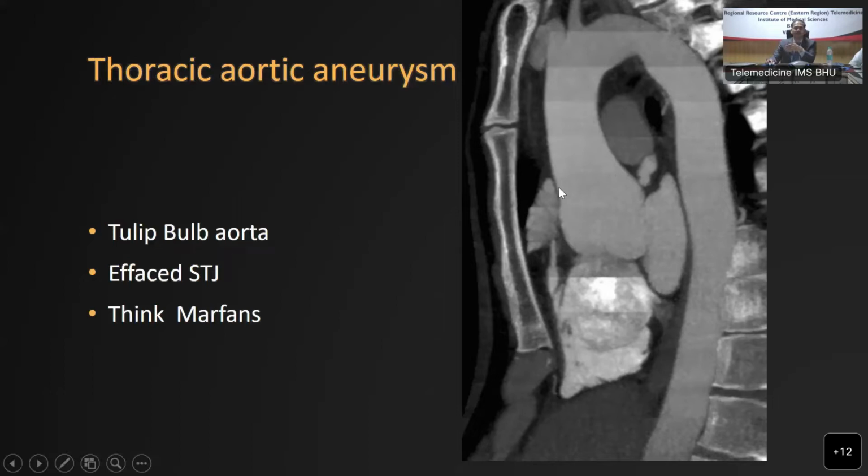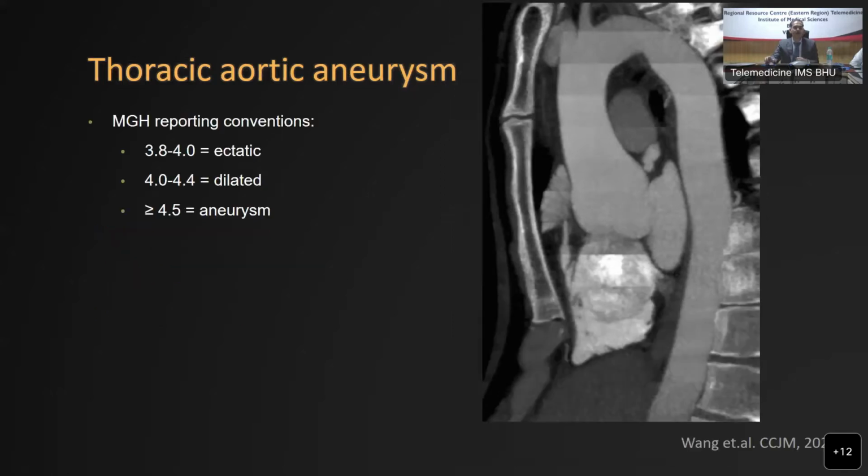These patients will have effaced sinotubular junction. So you can see that indentation that I showed you on slide 1 is gone. And these patients can present with aneurysm, or they can also present with dissection because these patients have connective tissue disorders.